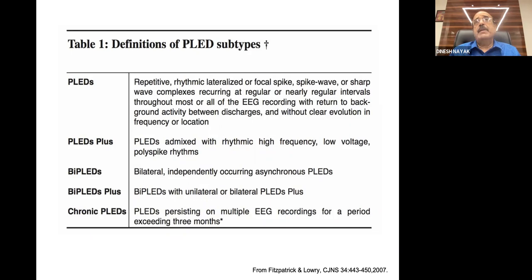That's the important point. You can't just say PLEDs if you have it for only, say, 5 seconds or 10 seconds, and then it's not there for the rest of the 25 minutes. No, that's not PLEDs. It should be there for much of the recording. And a very important point: between the discharges, the background activity is coming back, and there is no clear-cut evolution. That means if something is happening every 1 second or 1.5 seconds, that inter-discharge interval remains the same throughout.